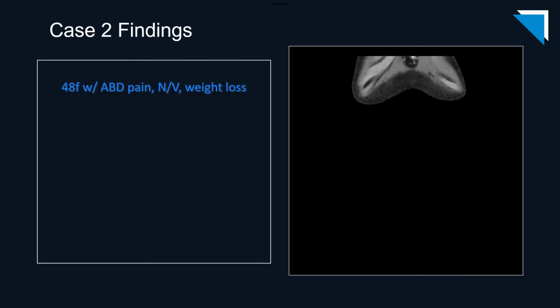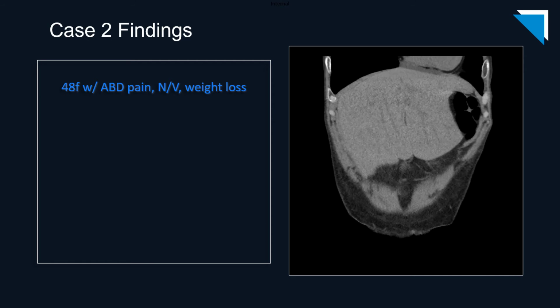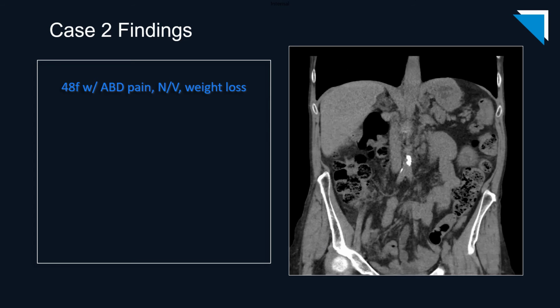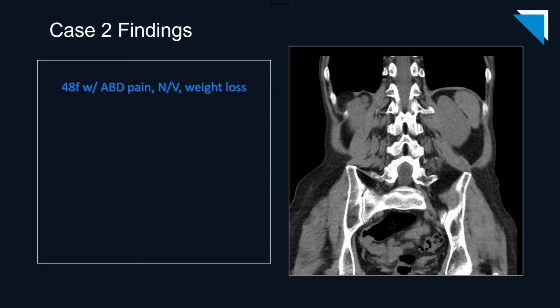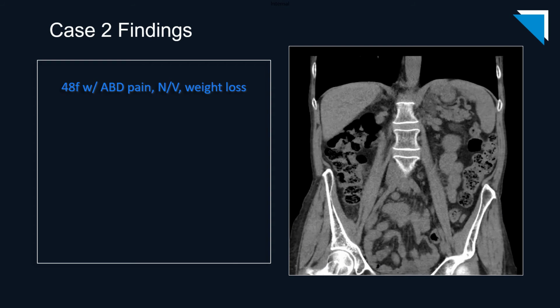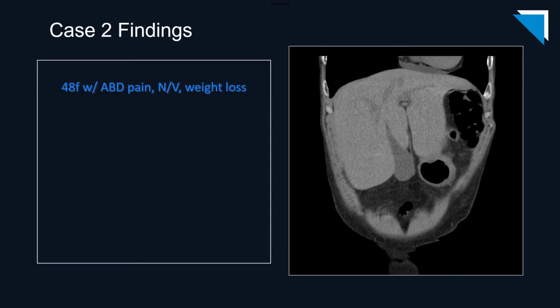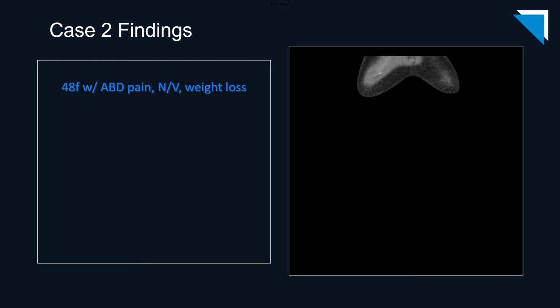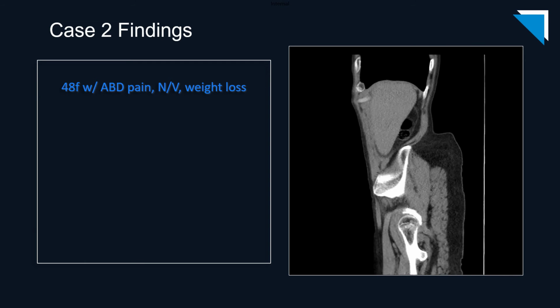Here are the coronal images from the same study. Finally, the sagittal images from the same study.